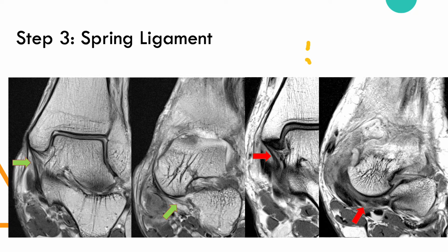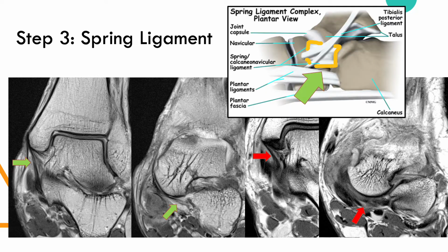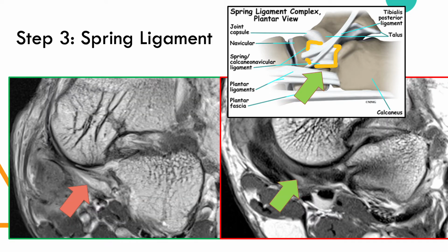One can see how in patients with coalitions, there is significant thinning of the calcaneonavicular ligament, especially as it traverses the talar head. When there is uncovering of the talar head by the talar head moving more medially, it increases the loading on that calcaneonavicular ligament, which then results in injury and pain. Anatomically, you can see that is exactly where the calcaneonavicular ligament would be, between the calcaneum and the navicular, as the name suggests. There's no ambiguity there.